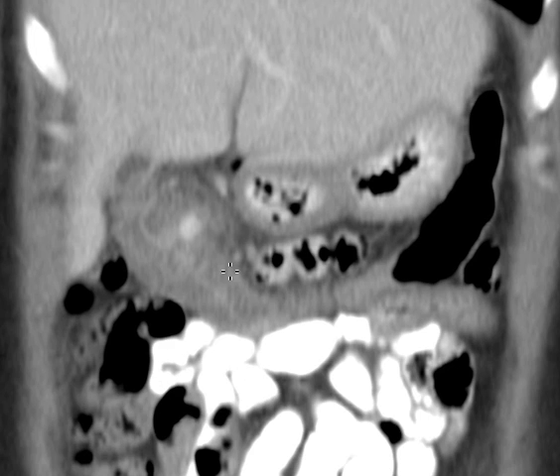So what this is, is a diverticulum, a colonic diverticulum. And what has happened is that this diverticulum became infected because it does not have a good rate of turnover of its content, and so when you have things sitting still inside the body, fluid particularly, that is not getting turned over or moved, it can easily become infected.